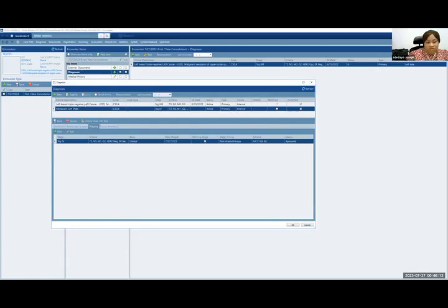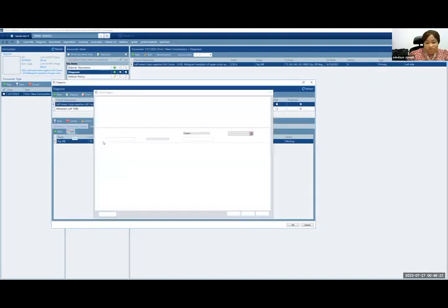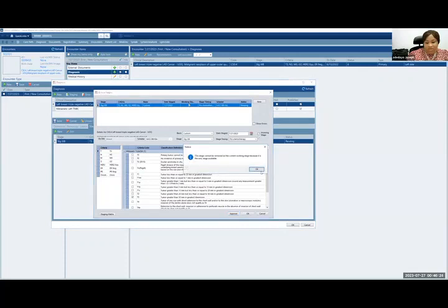What I'm now going to do is go to this old one. Yes, I'm saving my changes. I'm going to go to this old one that we did before and edit it to show that this is no longer the working stage. I have a new stage available, so why is it? Okay, let me save this first.